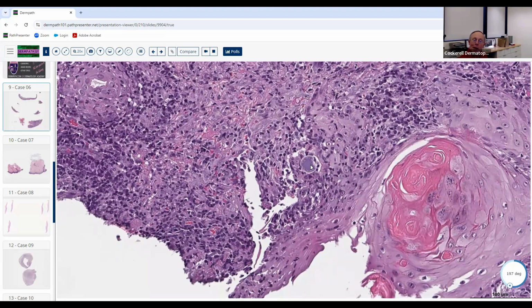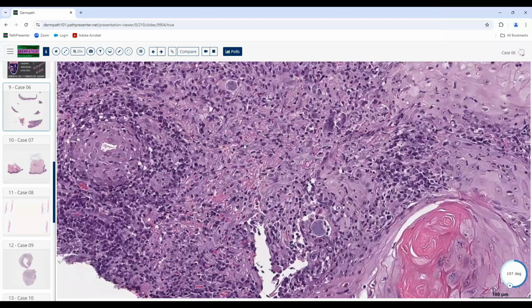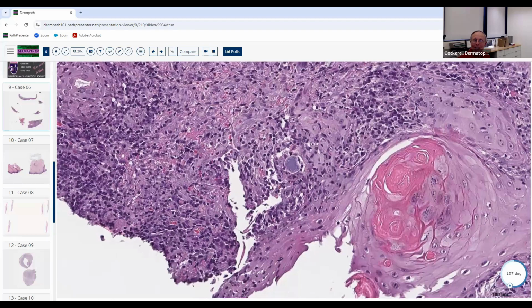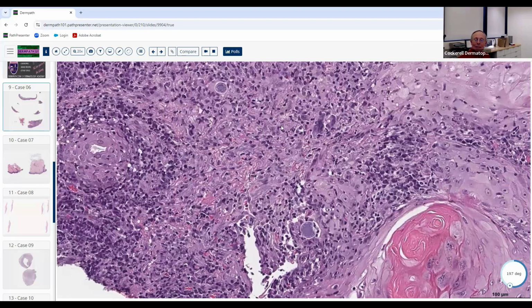They like to do that because they want to test your level of certainty. They want to say, we know that rhinosporidiosis also causes spherules. Does it cause spherules that look like this? I'm guessing they look different. They look a lot different, a ton different. They're way bigger, and they're not actually even fungi. They're kind of like a parasite.